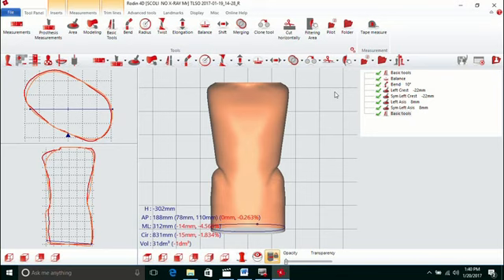Basically, that's a vertical axis model, spinal, cranial, knee, BK, AK, those types of model types. The other format is STL. That would be for AFOs or models that have more of a curve to them. And STL is also capable of exporting any type of model. The difference being AOP is a lot smaller, easy to attach in an email and send for fabrication.